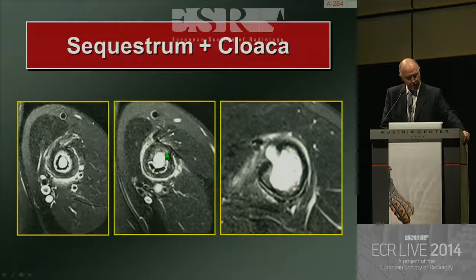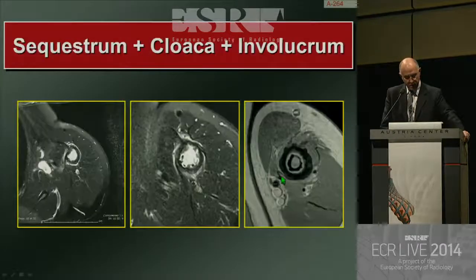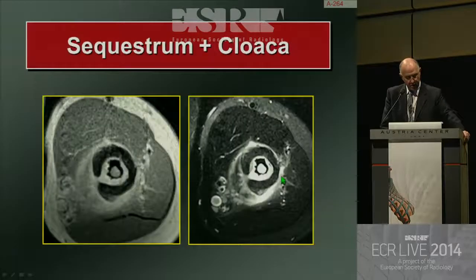However, you also need to identify the process, and the infection here, as you can see, is spreading. This is why you get this large sequestrum formation, devitalizing the blood supply to that bone. It also helps to show you what is going through the cloacae. This is why MR is so helpful, because if you see edema in the marrow and you think it's pus and a bone defect, then clearly the same process has taken place and is escaping through the bony cortex.